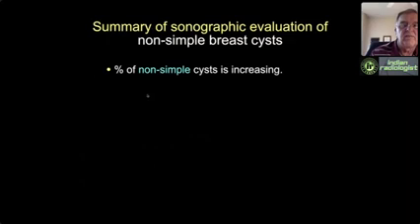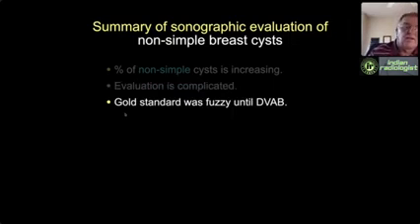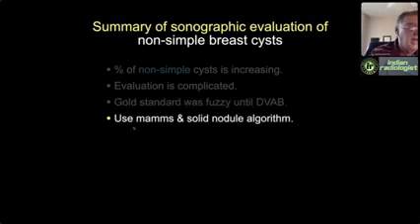So, in summary, we see a larger percentage of non-simple cysts than we used to because of better resolution and scan parameters being exceeded. The evaluation is complicated, and that is meant to be a play on words. The reference standard was really not clear until directional vacuum-assisted biopsy could remove only the part that was suspicious. We did not create a new algorithm. We simply apply the same algorithm used in mammography and solid breast nodules.